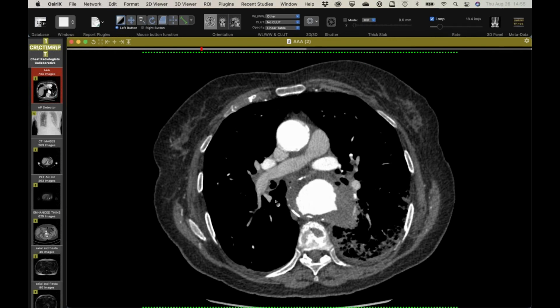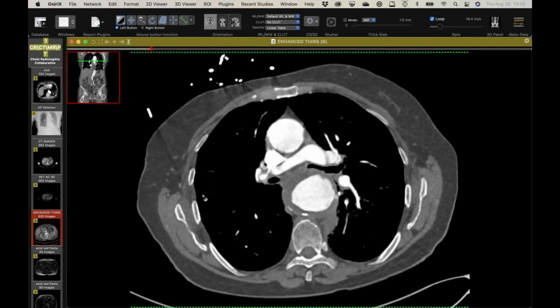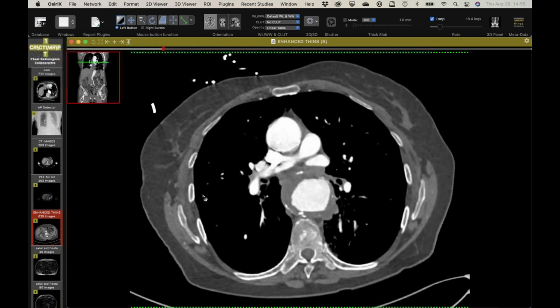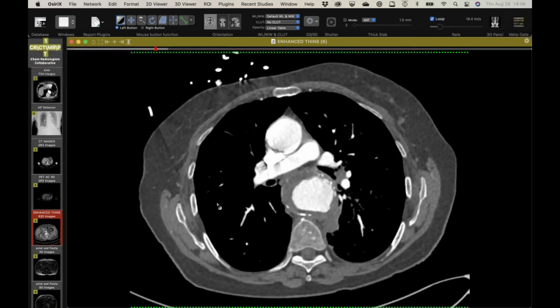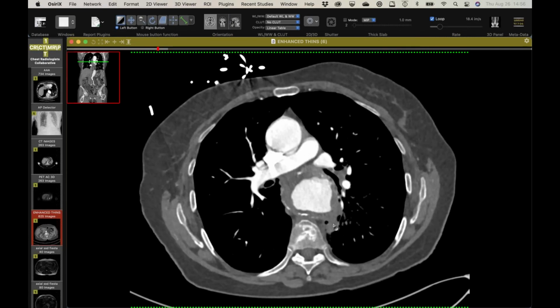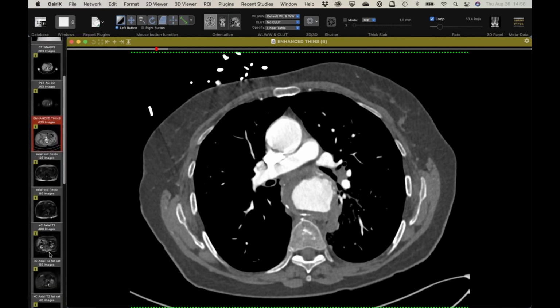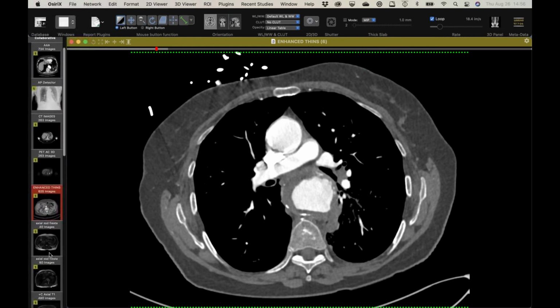Luckily, we were able to find out he had old imaging, and they were able to get it pushed to us electronically rather quickly. So this is about 3 months earlier. And you can see that that so-called mass was much smaller, and at this point really looks like it's part of the aorta. But it was on the outside, it was called a mass, so they did an entire workup with a PET CT that showed only minor metabolic activity there. So for something to change that fast and not have that much FDG uptake, I don't buy that it's a cancer.